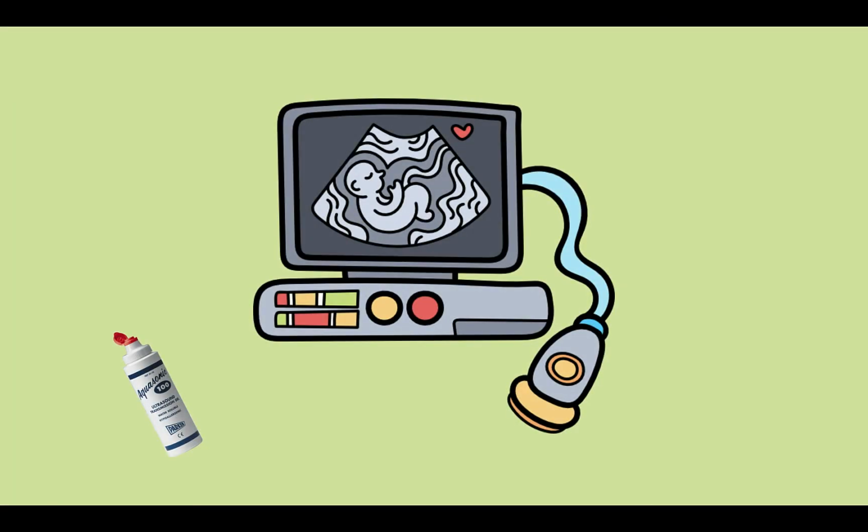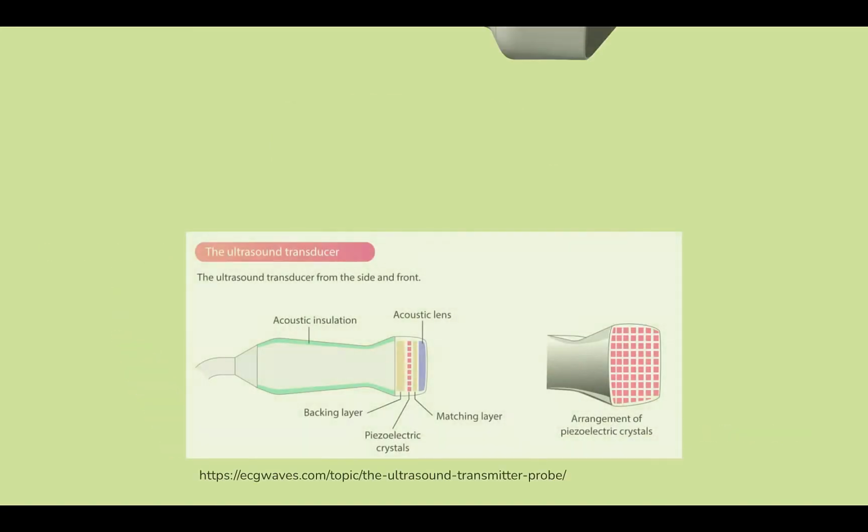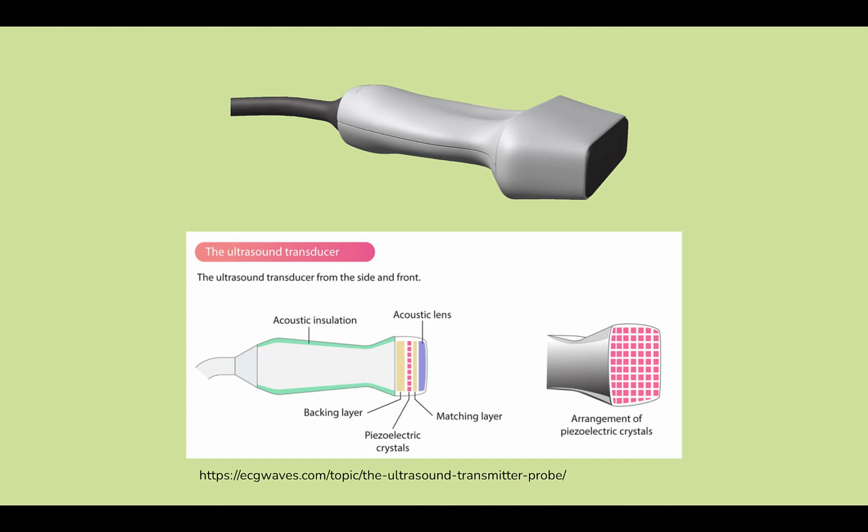With the help of a friction-reducing gel, ultrasound machines use a probe to glide over the area of the body under examination. The probe contains ceramic piezoelectric crystals that can generate and receive ultrasound waves when electricity is applied to them through positive and negative electrodes also within the probe. The electric current causes the crystals to undergo rapid shape changes or vibrations that produce ultrasonic waves.